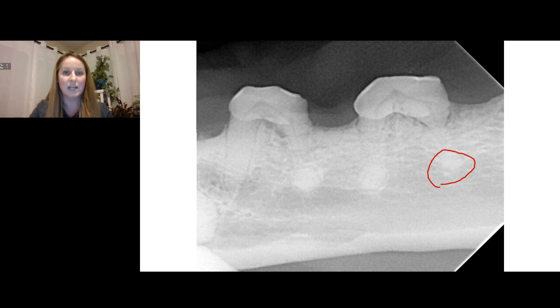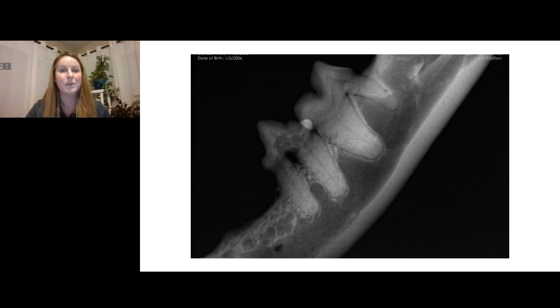We don't want to just get in the habit of doing a crown amputation, but we definitely want to treat these where if you look in the mouth and you still see tooth structure, you need to get it out, or radiographically. But when you don't have a mid-root section of a tooth, you're probably not going to be able to get to that little apical ball. So here you can see this is a mandible in a cat. Again, if we are just looking at how would I extract these, that's how you would extract those.